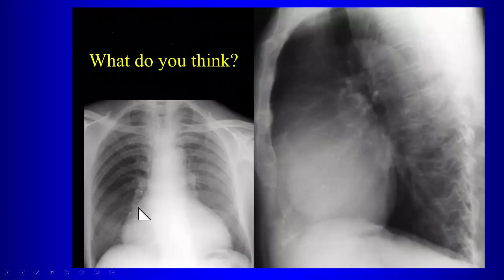So heart looks enlarged here. Why is the heart enlarged in this patient? Effusion. What's the sign of a pericardial effusion? The Oreo sign. The Oreo sign or the sandwich sign on the lateral chest radiograph. Wait, what's the Oreo sign? Sorry. Oreo, like Oreo cookie, the Oreo cookie sign. Or the sandwich sign. Fat and the... Yeah, so let's talk about it.